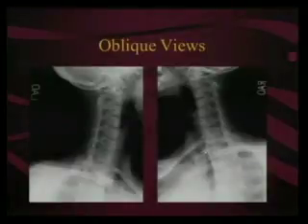Okay? So look, we've got vertebral bodies. We've got our pedicles. This is the opposite pedicle. This is the pedicle that's facing the screen. And look at our neural foramina. And look, down here in the lower vertebral bodies that were obscured by a humeral head on our swimmer's view, we can now see them. Okay, so LAO view, RAO view.